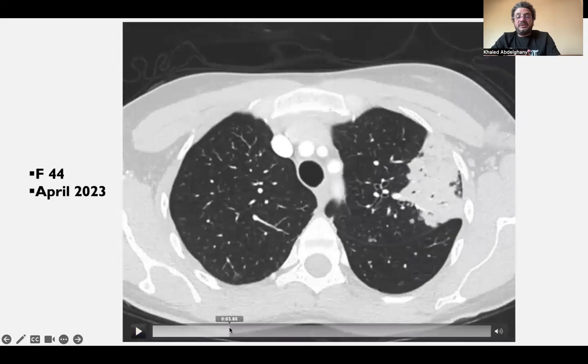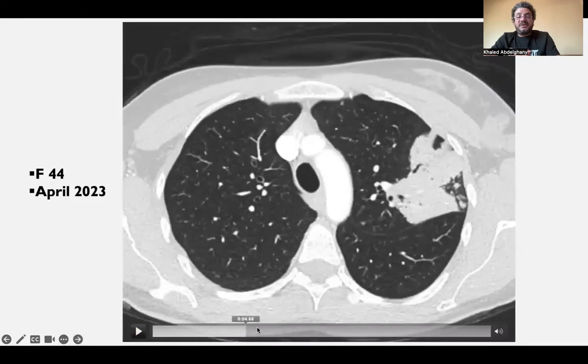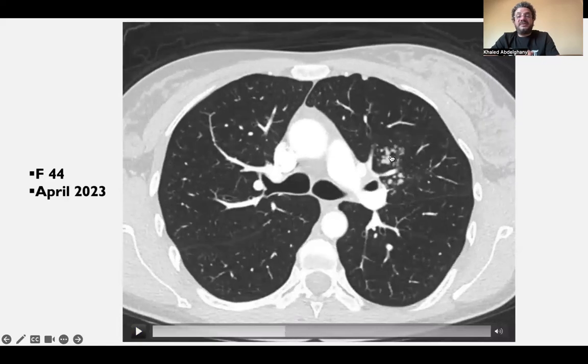See the nodule here. It's obvious the nodule is resting on the fissure. So it is a possibility. But in clinical practice, this is not happening. I want to show you also here the tree-in-bud, which can happen in either infection or tumor because of endobronchial spread of infection or tumor cells.